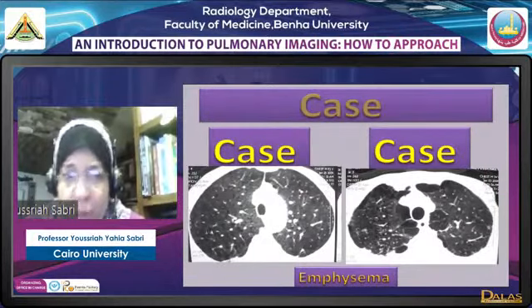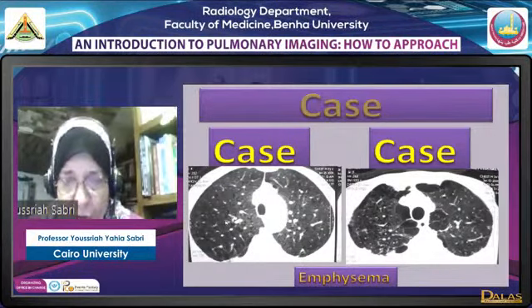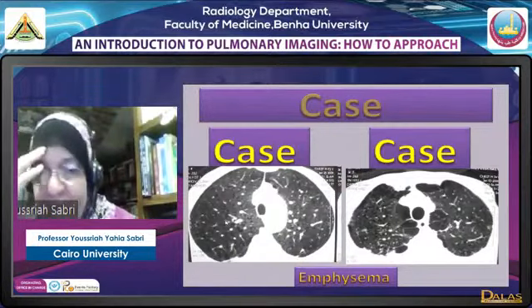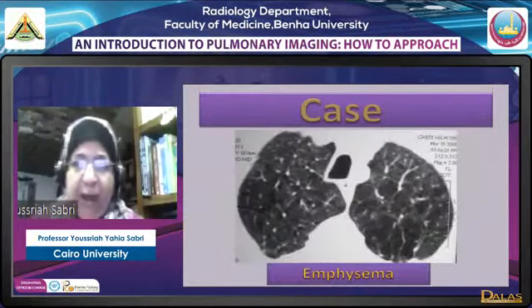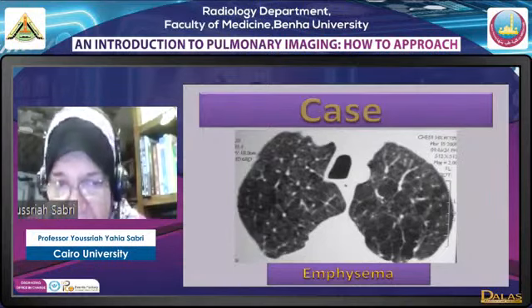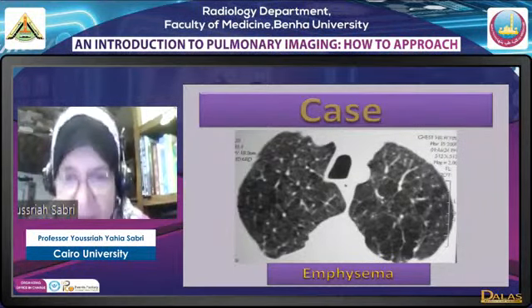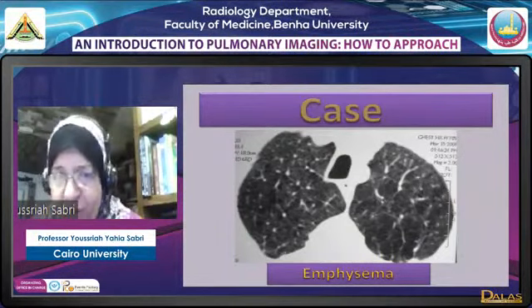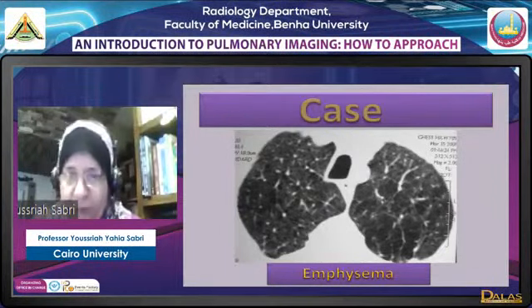Again, emphysema is a small airway disease, don't forget this. And here we have on the left side central lobular emphysema, holes without walls affecting the upper lobes. On the right side, we have holes without walls and peripheral bullae and blebs, paraseptal emphysema. Now here we have on the right lung central lobular emphysema, and in the left lung, as you can see, there is marked hyperlucency affecting the whole of the secondary pulmonary lobule. You can see the wall of the lobule now.